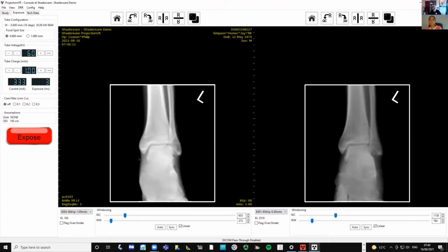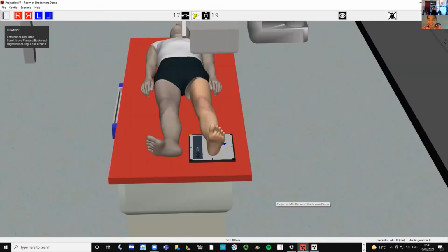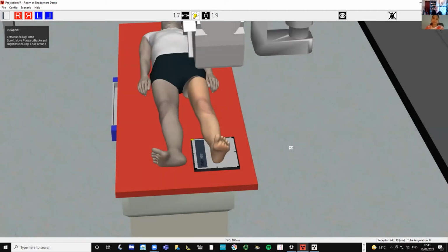And then you're able to give feedback to the student and explain why that's what they got and why they need to do something different. And of course, the student gets to repeat and repeat and repeat, which is what they can't do in clinical practice if you're x-raying a person. They learn much quicker. You don't have to wait for the next ankle to come along to have another go. Learning by doing. Yeah, absolutely. Very experiential learning. It is. So that's that system.